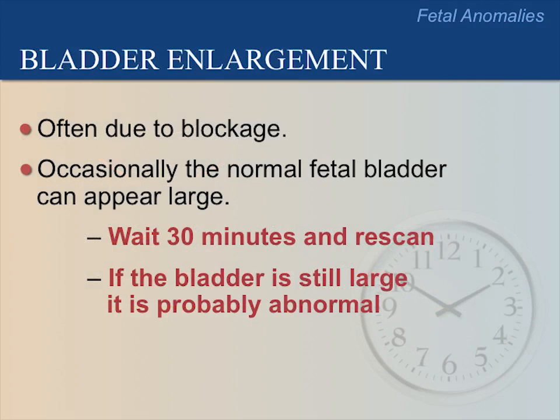The bladder may also become enlarged, often because of a blockage. If the fetal bladder appears unusually large, rescan after 30 minutes. If the bladder is still large, there's probably something wrong, and you should refer to the hospital.